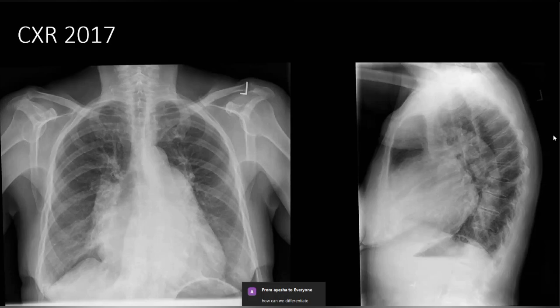In the rest of the lung fields, I can see somewhat like upper lobe diversion or sporadic lesions noted in bilateral upper lobes. However, the lung volumes are preserved. I don't appreciate any evidence of nodular opacities in the bilateral lungs. Pulmonary conus is also prominent.